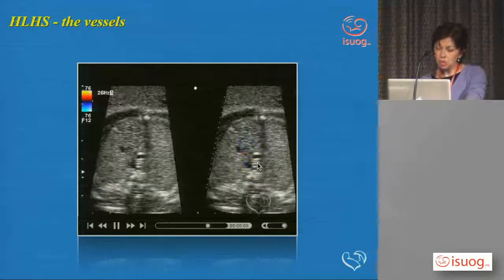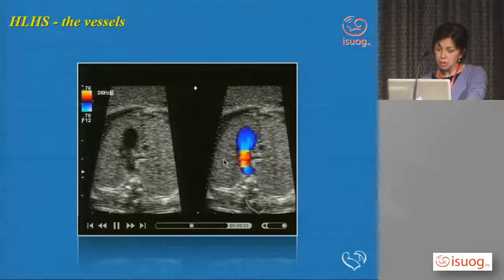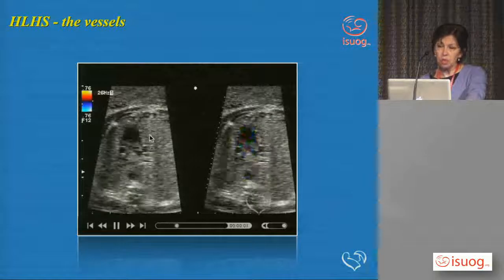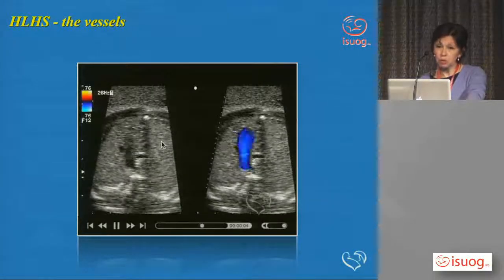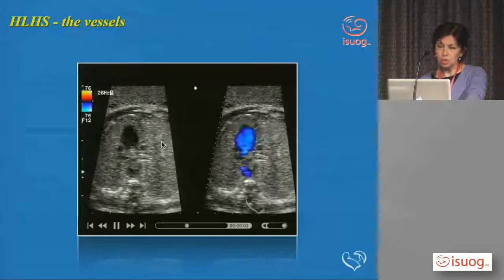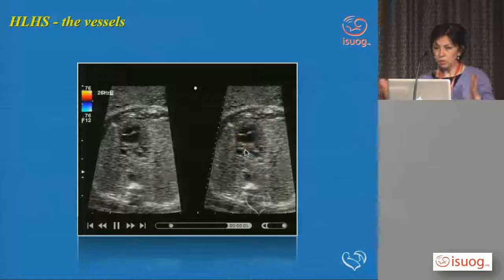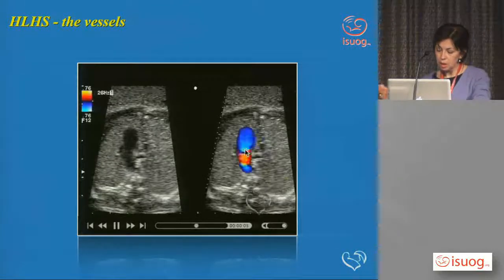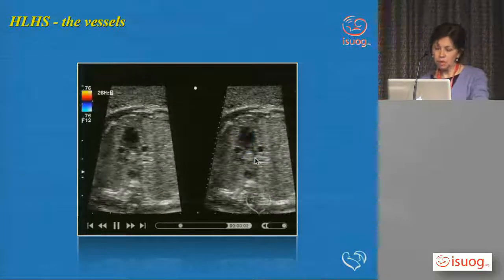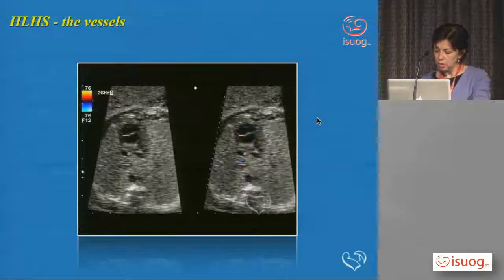So the mitral atresia in itself does not mean hypoplastic left heart syndrome, because some cases that have mitral atresia may actually have the aorta and the pulmonary artery both coming off the right ventricle. So if you don't have the aortic atresia as well as the mitral atresia, it's not hypoplastic left heart syndrome. In this case, you have to have the full spectrum, aortic and mitral valve involved, and reverse flow in the transverse aortic arch. If you haven't got that, it's not hypoplastic left heart syndrome. It may be mitral atresia, but it's not hypoplastic.